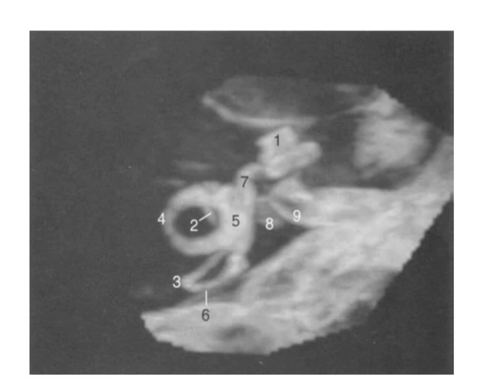This is MIP, maximum intensity projection, like myelogram, like MRCP, for example. All of these show the signal of the fluid to the maximum. You can see here everything white is fluid. The internal acoustic canal, the cochlea and the semicircular canals are all filled with fluid. That's why we see it so obviously. This is the semicircular canal. This is the cochlea. This is the cochleovestibular duct. This is the blind end of the endolymphatic duct. Nice.